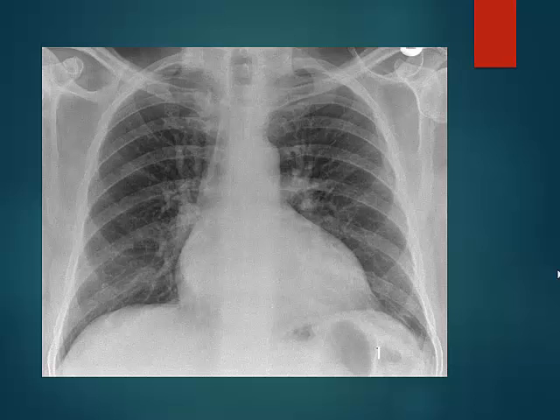What about the pulmonary vessels? The upper lobe diversion or upper lobe vascular redistribution is there. Okay. We'll look at that again. Anything else? So increased heart size. Second is upper lobe vascular redistribution. And anything else? Third, lungs otherwise clear.